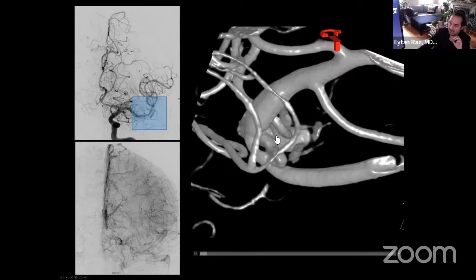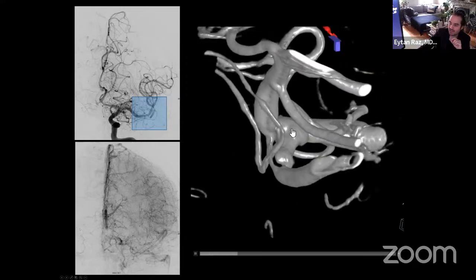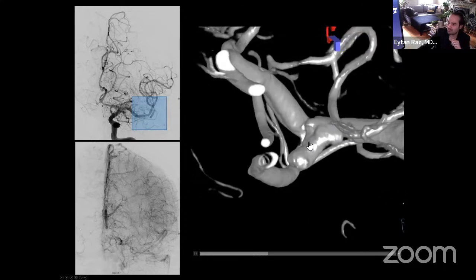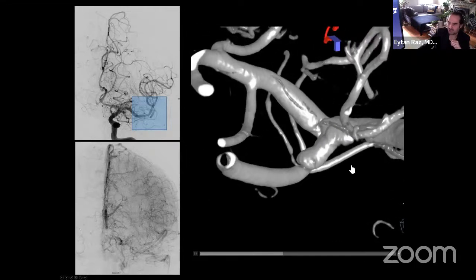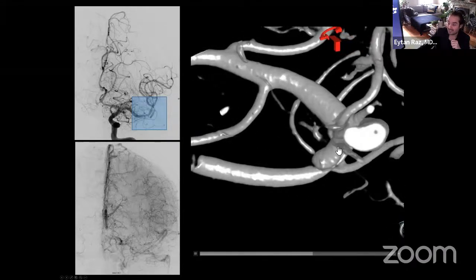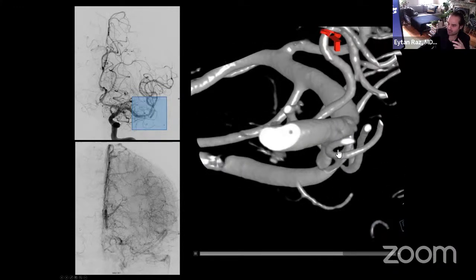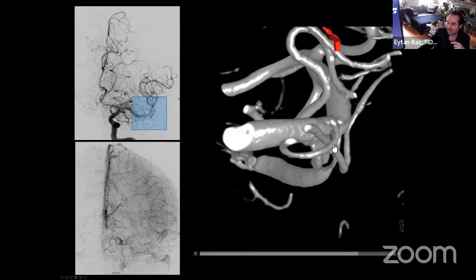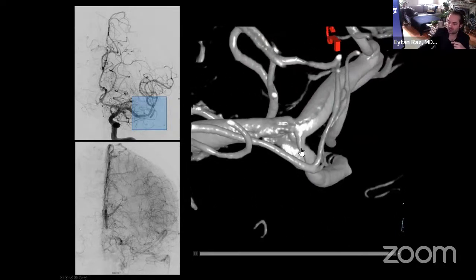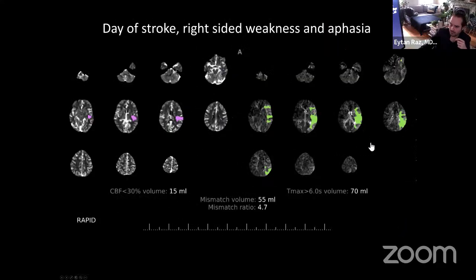But when you play around with this, you understand that there is a double lumen, sort of like a pseudoaneurysmal sac that is actually pushing on the inferior branch and causing stenosis of it. So this is a dissection, no question. When I show you this imaging, there's no question you understand this is a dissection with a blind pouch sac from it that is pushing on the inferior division. And look at this also, there's a little flap going also to the upper division.